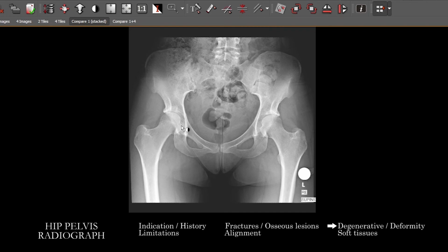We're going to look for degenerative changes, which we see in both the hip and lower lumbar spine. You'll see that also at the SI joints and the pubic symphysis. And also, in the appropriate circumstance, you're looking for abnormal fusion, ankylosis of the SI joints. These are not going to be commonly seen, but are something to keep in mind every time you look.